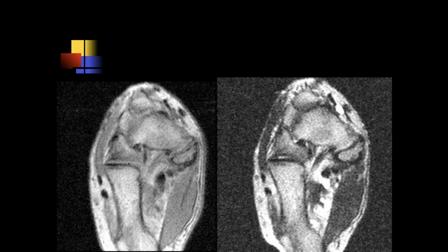Actually, here's the navicular up here, and this is the cuboid. I'm not talking about articulating with each other. I'm just wondering, because the navicular axis compared to the calcaneal axis looks a little weird. I don't know if it's just the angle. And then I do notice that there's a type 2 os navicularis, which I think is non-edematous.